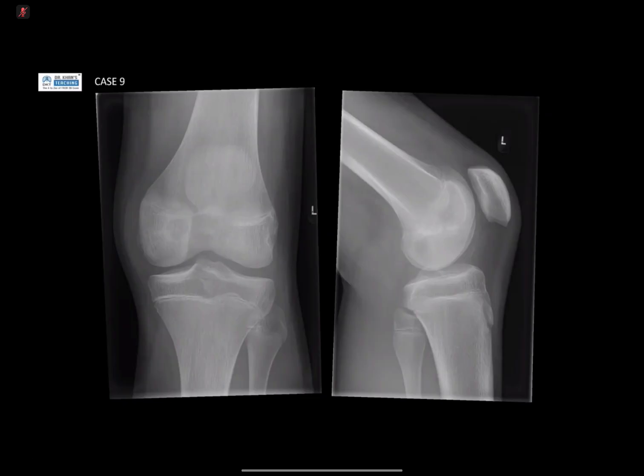For this young age, I'm worried about infectious pathology. This could be a Brodie abscess. I need to do MRI for more delineation and characterization of this pathology. Good. And any other differentials that you know of lucent lesions that occur in the epiphysis that you would include in your differential? Another differential for a lucent lesion in the epiphysis could be chondroblastoma, in the immature skeleton.